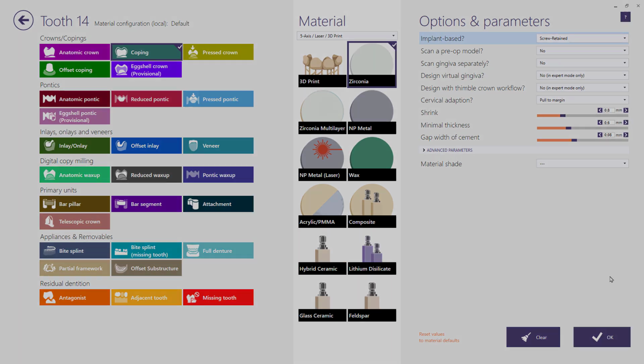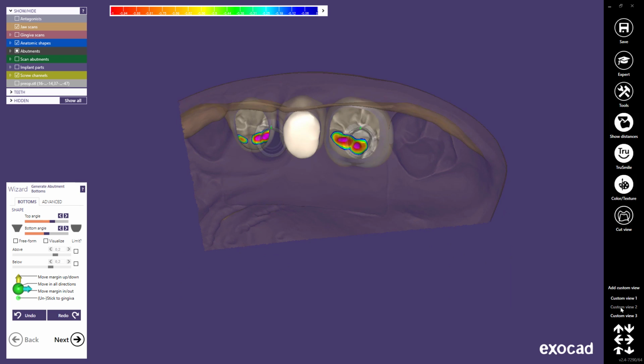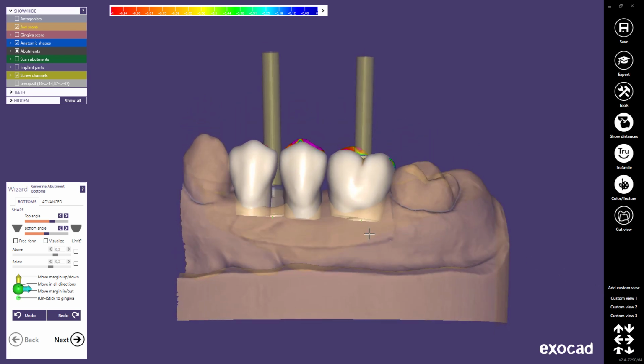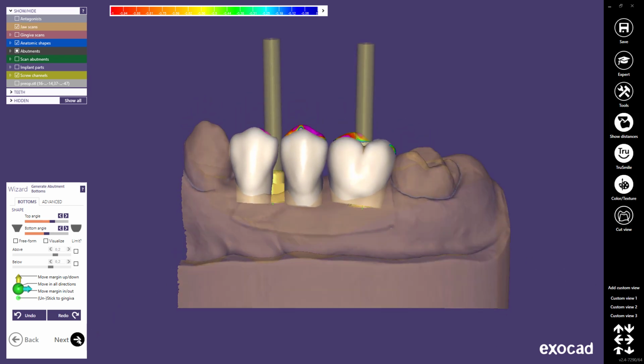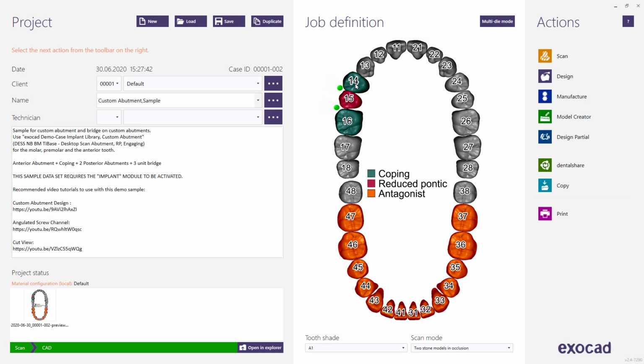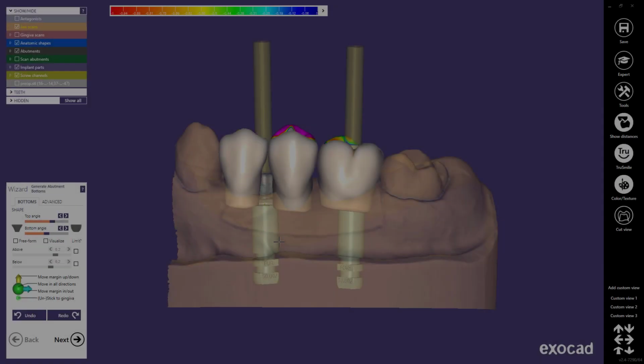Let's see this in action. After the tooth placement and abutment bottom design, you can see the margin of the anatomical tooth library is pulled to the implant platform or the margin line. The tooth may become deformed in the process. Preserve library shape will load pontics instead of crowns in tooth placement, which in fact is similar to the digital wax-up workflow.